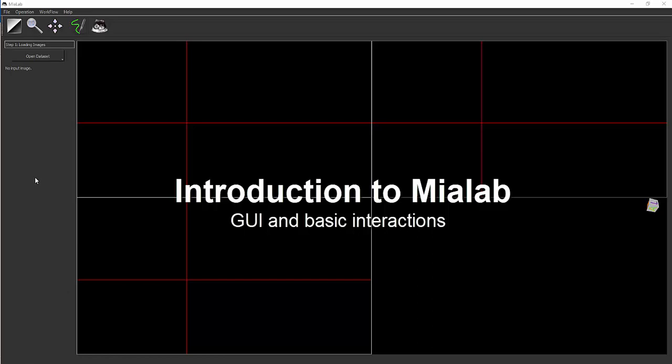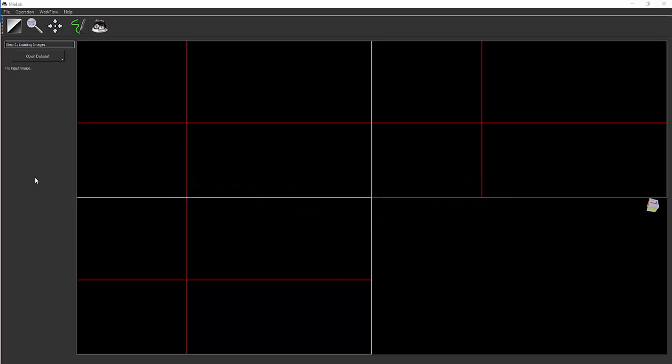Hello, welcome to this introduction video of Mialab. In this video, I'm going to walk you through the user interface of Mialab and some basic interaction with the software. First, let's try to open a medical image.